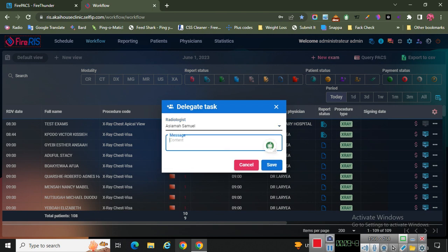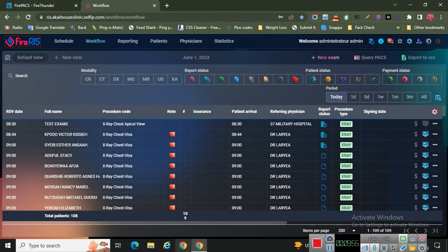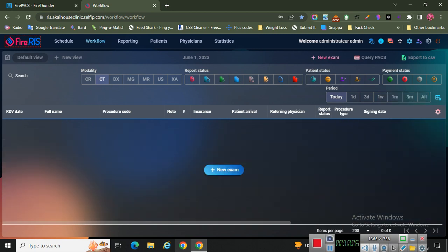That's it. I'm going to have to add some more names here, Dr. Nixon and Dr. Mahed, and I'll add you and give you login details. There's one thing I wanted to show, CT. Let's go all and see. It's a bit slow, I don't know why.